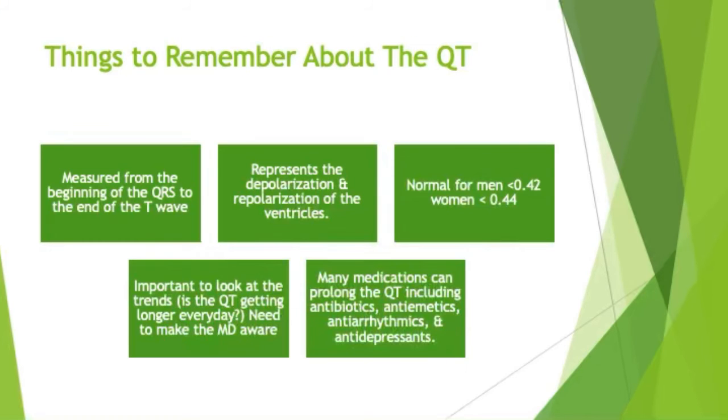The last thing I want to talk about on this video is the importance of the QT interval. Normal is 0.44 or less, and a prolonged QT can increase a patient's risk of polymorphic ventricular tachycardia. A large majority of our patient population is at increased risk.